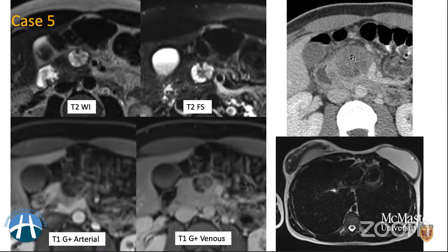So you saw that the left breast tissue is absent, so probably mastectomy, and then you start to include more differentials. So anyways, we thought that this is probably something which is happening, and then we started reviewing the final breast pathology, why the patient underwent mastectomy. So it was for a malignant phylloides tumor, and the surgeons resected this mass, and it turned out to be a phylloides metastases into pancreas. So that's pretty rare, but just something to remember that pancreas is not a common site, but you can have all of these tumors to go there.